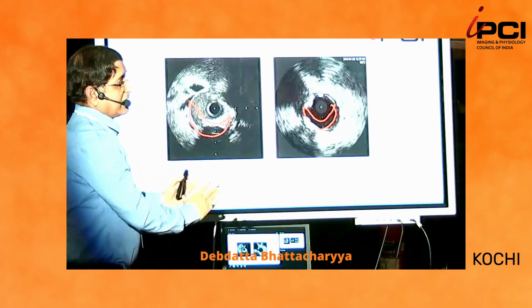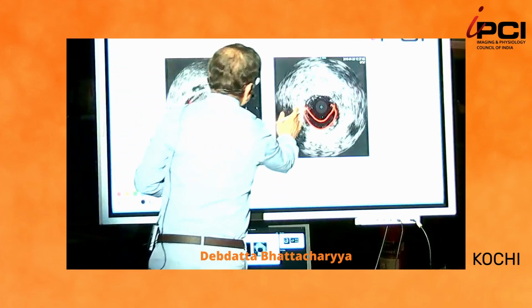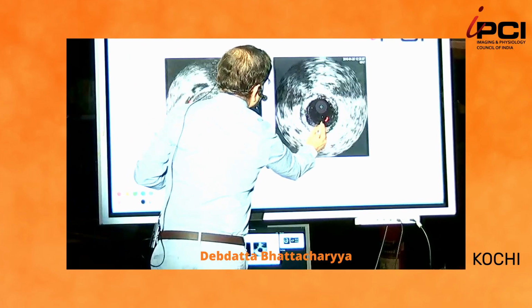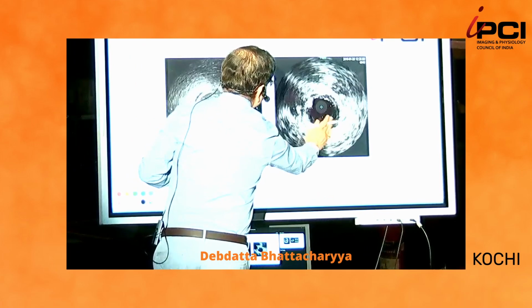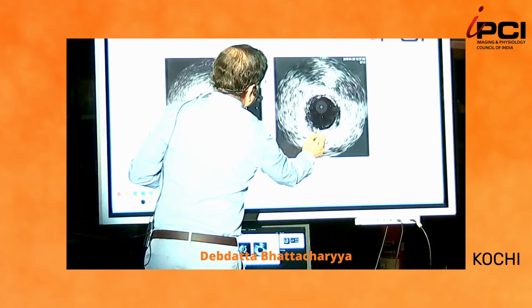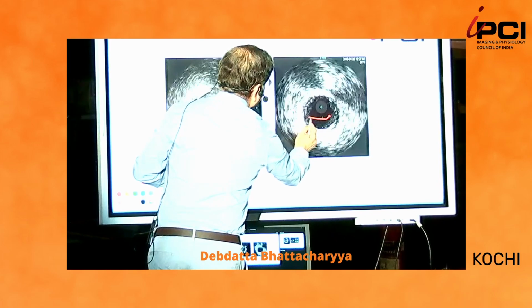They come as if they come from the center of the beam. As a result of this, you see the side lobes. So there it is. I will help you to pick it up. There.